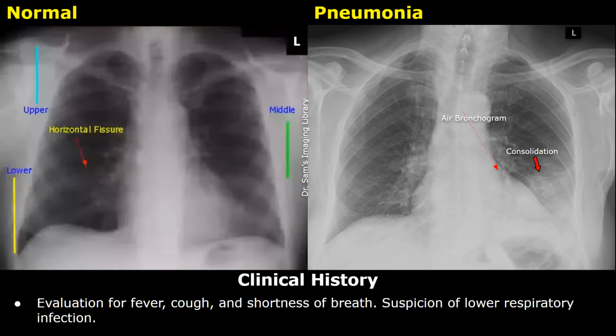You will learn how to write X-ray reports regarding different cases of pneumonia. We will see different types of pneumonia cases and the report will be written according to the findings on the X-ray. The left image is a normal chest X-ray and the right image will be showing pneumonia cases. The normal image is just for comparison.